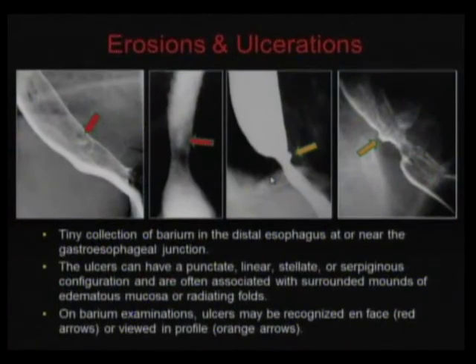On face, and okay, this is a lateral view of the ulceration. Usually they are associated. You can see, for example, here that there is a stricture, same as here and same as there. This is a hiatal hernia. So it's not an isolated ulceration surrounded by normal mucosa. No, everything is abnormal. The ulceration is one of the findings.